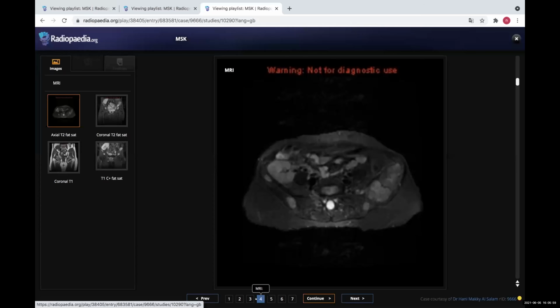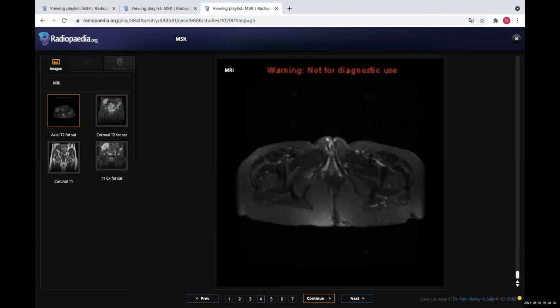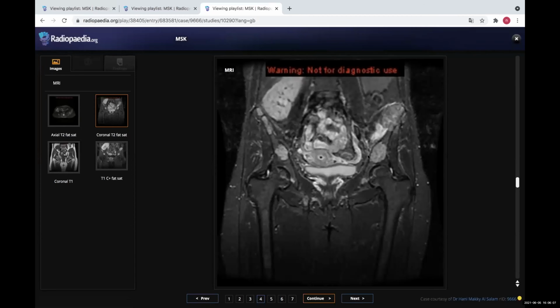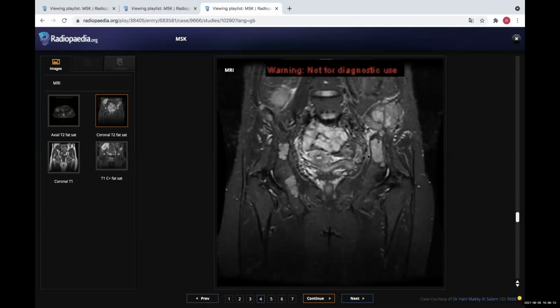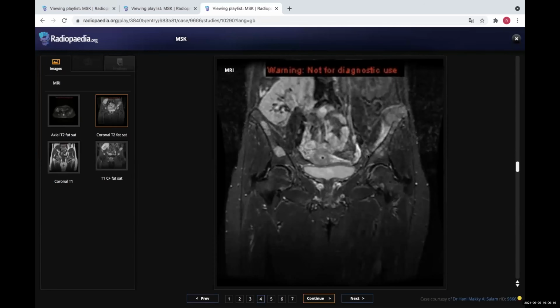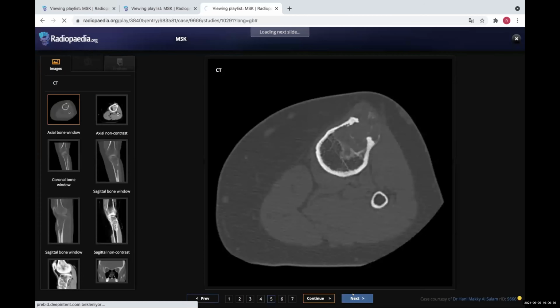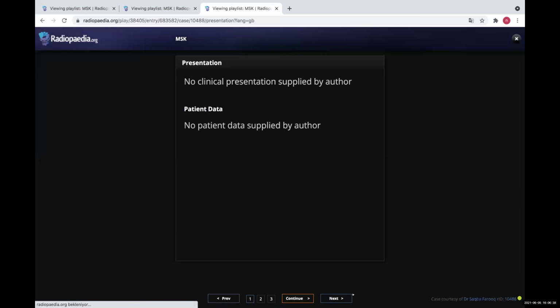I can see the transplanted kidney in the right lower quadrant, and again, multiple expansile lytic lesions involving the pelvic bones. So probably this is a previously operated renal cell carcinoma. Or another differential I'll be thinking of is brown tumors. All these lesions are brown tumors. Okay, thank you. I will continue. No, I will leave this case. You did well in that one.